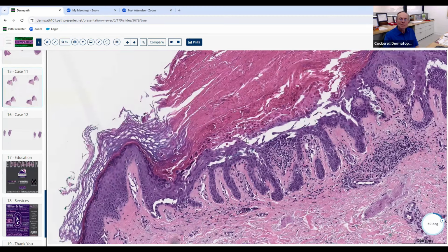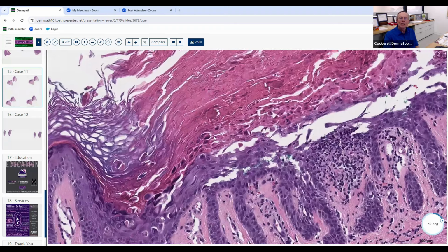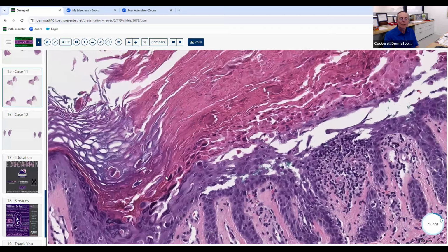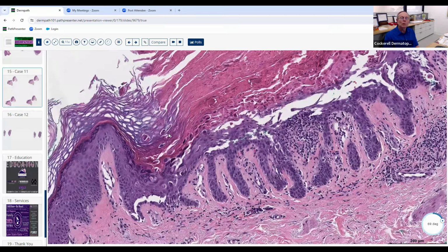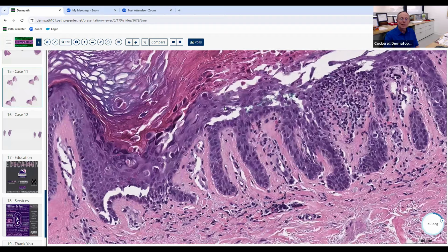It's got the classic findings of focal acantholytic dyskeratosis, cells aren't hugging each other anymore. The most common setting is Grover's disease. And as I'm sure you guys know, there's about 6 different subtypes of Grover's, ranging from the superficial and deep types of pemphigus, the Hailey-Hailey type, the spongiotic type, and then this type, we get FAD.